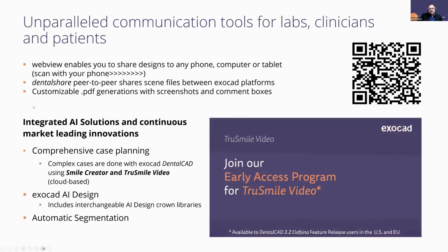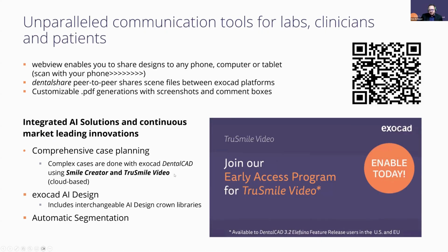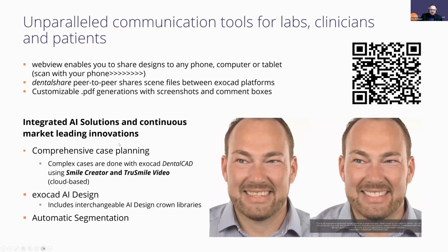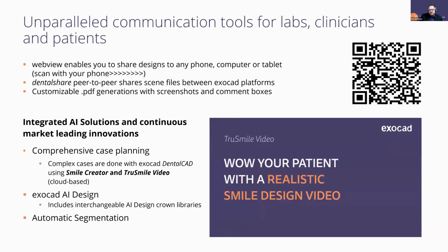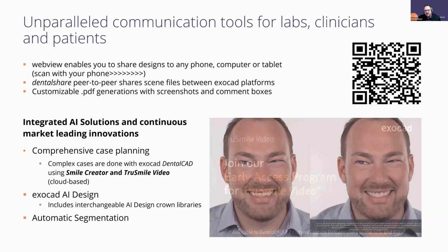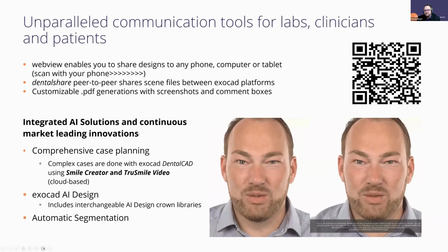And now, again, to touch base on the integrated AI solutions. So we've been talking about True Smile Video. You can see this example on the bottom right here. So basically, when you utilize Smile Creator, you're going to have the ability to give the patient a presentation on what their new smile is going to look like. And at the end of the process, you have the ability to upload up to a 30-second video of the patient smiling, laughing, talking. And our AI services is going to take that video of the patient talking and replace it with your design. And as you can see in the example down here, the rendering looks amazing.